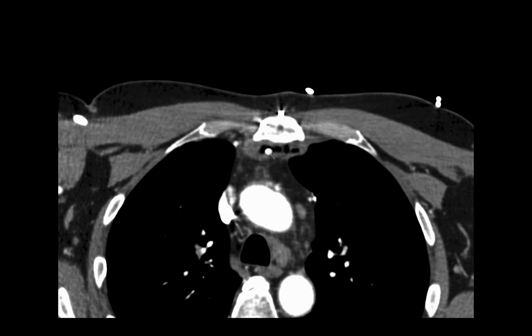And in this patient, there had been some bleeding, and they put some Gelfoam in the chest right behind the sternum. So this corresponds with that. And this has been reported in the literature, usually in the abdomen. It's not a common location to see Gelfoam in the chest, but I've now seen a couple of these cases. So anytime you suspect something might be a retained surgical body like Gelfoam or some of the other sort of hemostatic things that they use, you can always correlate with your operative note.